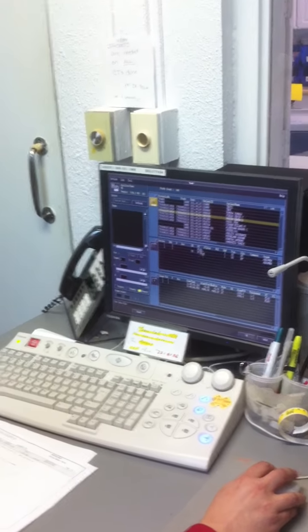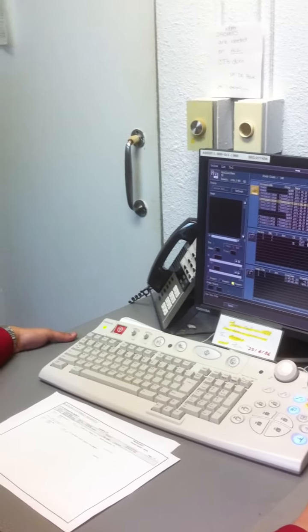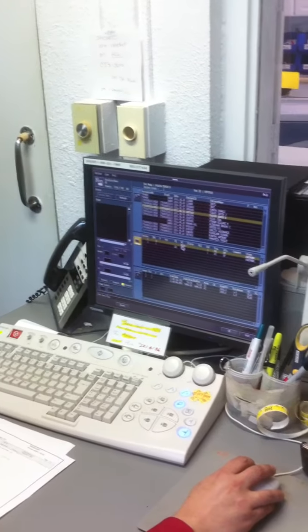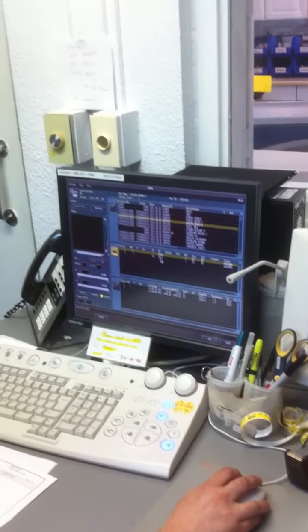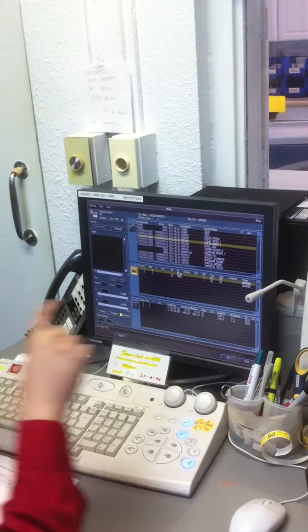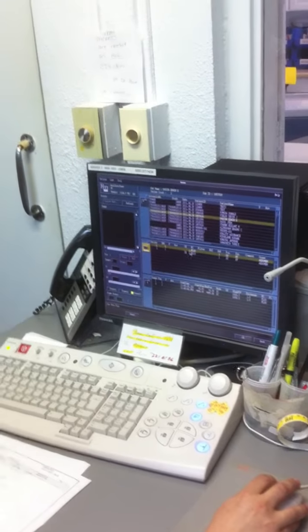There's the helical. How do I know the difference? What is this? Why is that a scout? You're right. But why are you right? Because right here it says first scan. It says FL, not FC. FC is always a round reconstruction. FL is linear, like straight. That's right. Very good. Circular and linear.